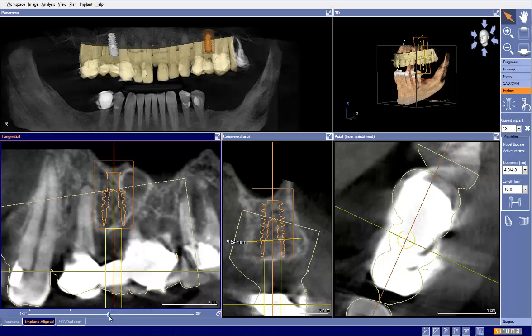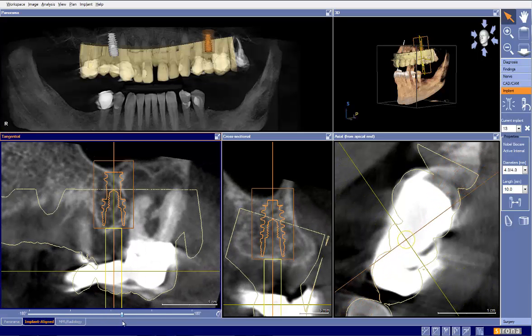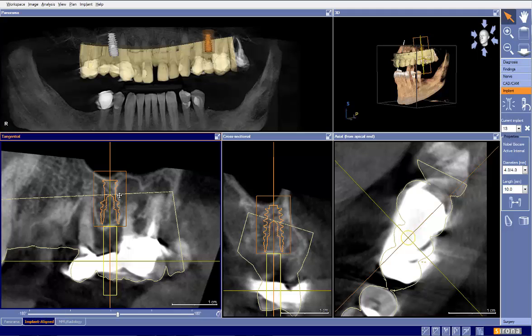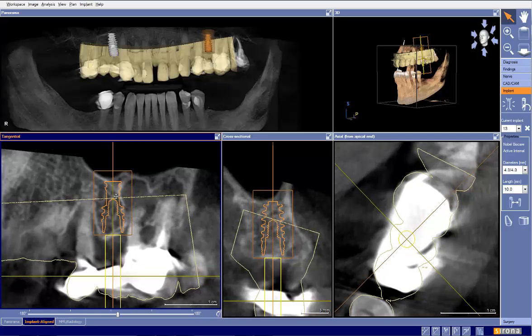The bigger question I have on this particular one is the ability to place this immediately. One, in taking this tooth out, site number 14, let's call it, we're going to have a significant bony defect. There's some infection here. We can see that it's encroaching upon the implant space there. This may be a situation where I would probably recommend to have this tooth taken out, the site cleaned and healed, and then come back and place this implant. I just don't want to take the risk of this implant failing because of anything going on with this tooth right here.